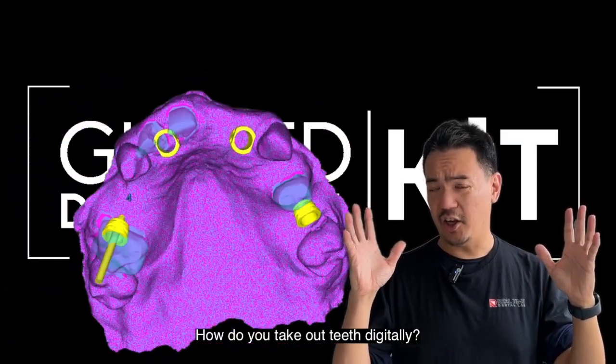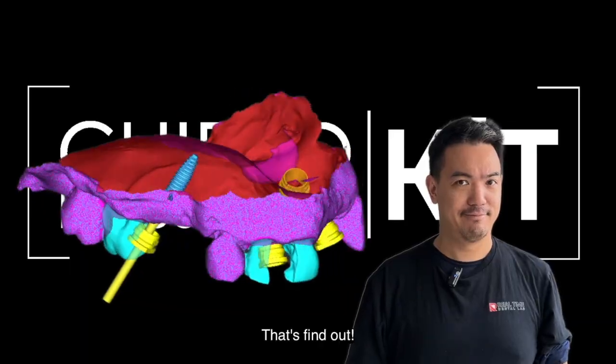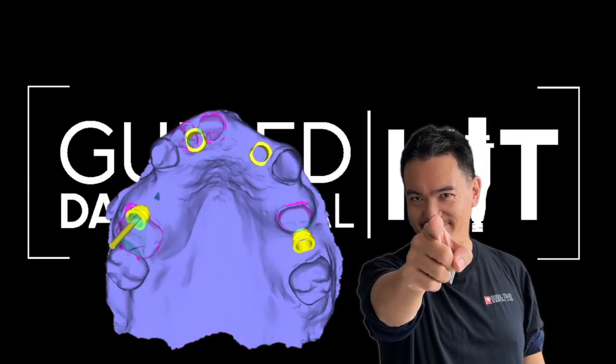How do you take out teeth digitally? Let's find out.